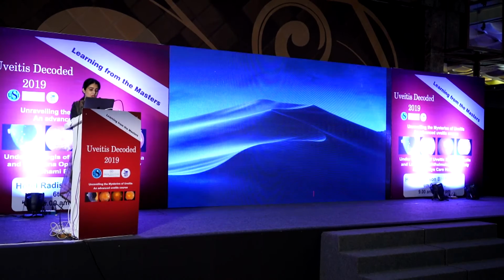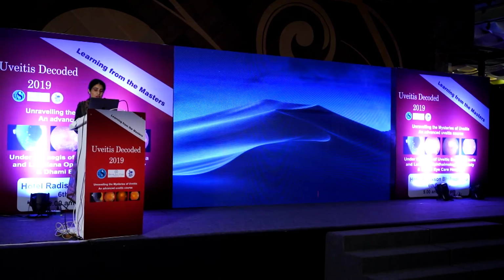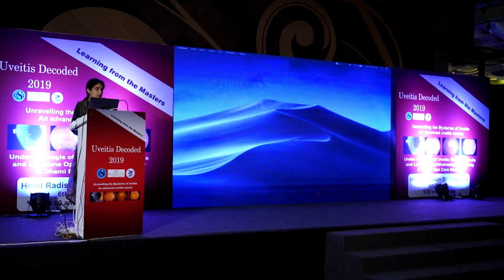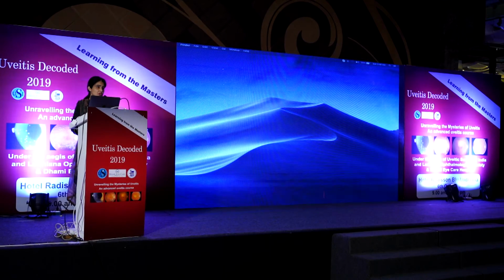What Dr. Anirudh has defined. He has very clearly, beautifully shown you a lot of pictures of OCT angiography where it is useful in cases of uveitis. In my talk, I'll be talking to you about the wide field OCT angio. That means we are just broadening the images, as we all know that uveitis is not just restricted to the posterior pole.